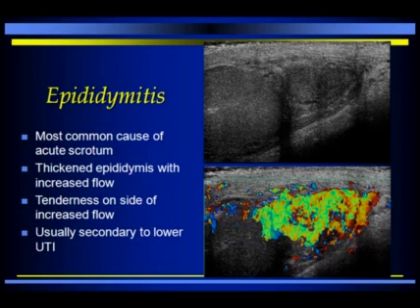So let's move a little bit now towards the evaluation of the tender testis. Scrotal pain is probably one of the most common complaints that people come in for, where we do ultrasound of the testis, especially young men.